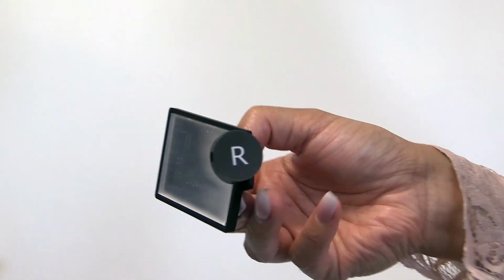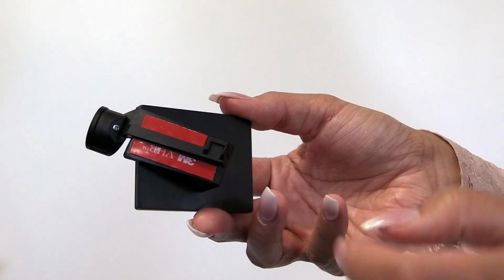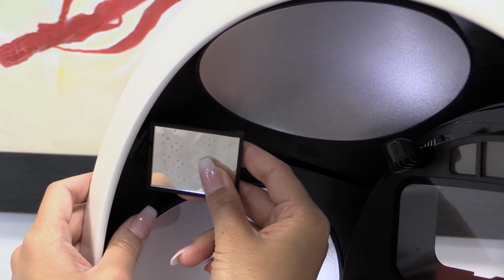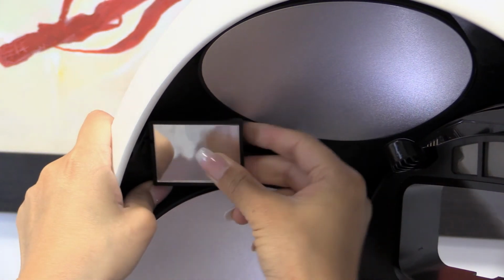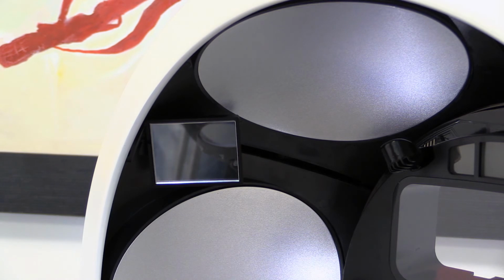If you want to attach the mirrors permanently, first remove the protective foil from the adhesive tape on the back. If not, you can leave the protection foil on. To attach the mirrors, place the magnetized part of the mirrors against the inside edge of the OBSERV and it will click into place. To secure it, push the lower edge of the gap inside the OBSERV slightly down and hook the back of the mirror into the upper edge of the gap with a rotating movement. Do not hesitate to apply some pressure.